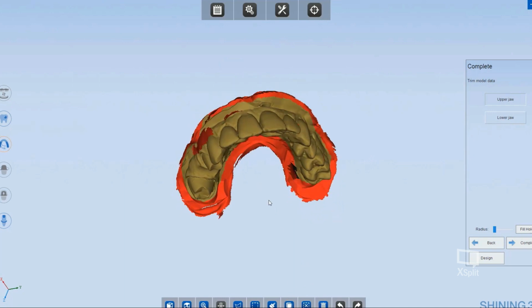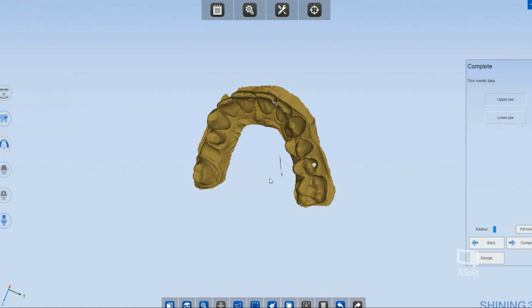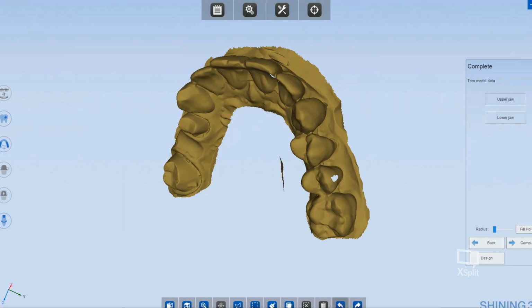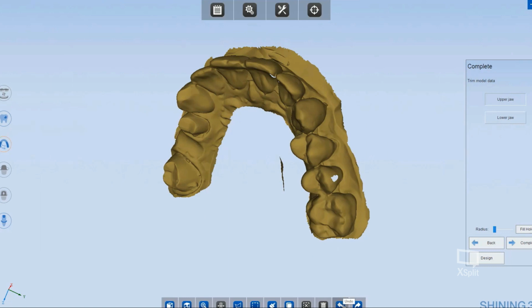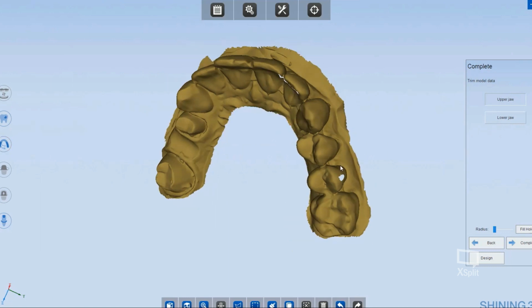Inverting selection, just a check, and that's it. If I do something wrong like this, I can go back for restoring the previous situation.